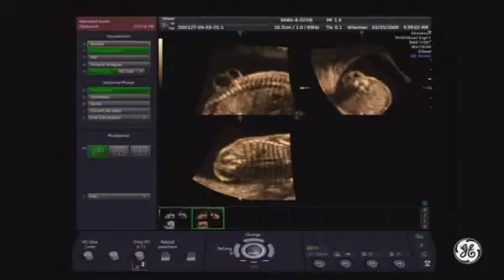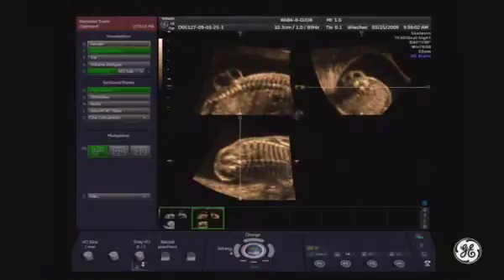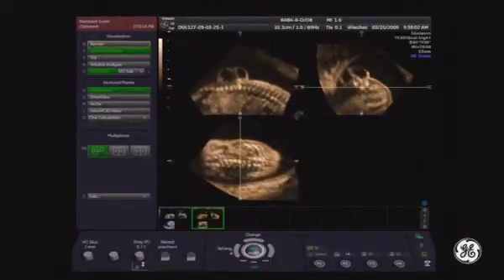Then I will rotate the site of the defect and I will try to use some tomographic imaging in order to estimate the level. So let's start with the rotation first. I need to select the reference image A and bring it horizontally by Z rotation, like this. Then I will select the reference image C because here we can see the coronal plane. So the last pair of ribs would be clearer. And I will select the reference image C.